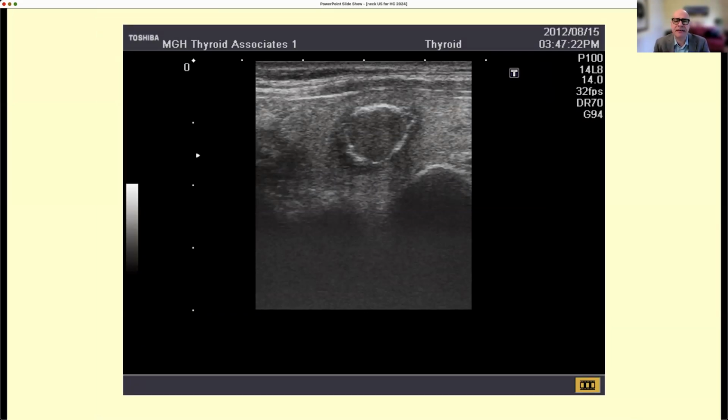Any taker for this one? That's an interrupted calcification nodule. It doesn't look like an eggshell calcification because there's an interruption in there. Right, on the upper left corner. Yes. So these are discontinuous calcifications, almost continuous, but discontinuous to a certain extent.